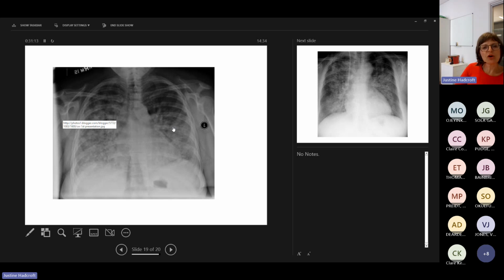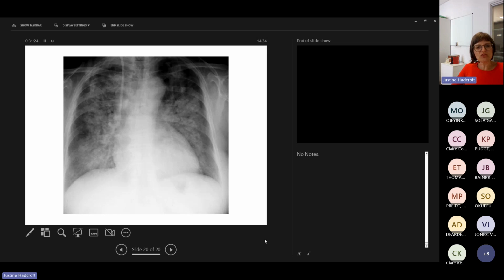So this was probably COVID pneumonitis, and we probably got very used to seeing that back in early 2020, and we've probably not seen much of it really since 2021, have we? And then this is the last one, which is similar to the previous one, but anybody spot any slight subtle differences or anything that we don't usually see on a chest X-ray? There's a tube as well, right? There's a tube in there somewhere.